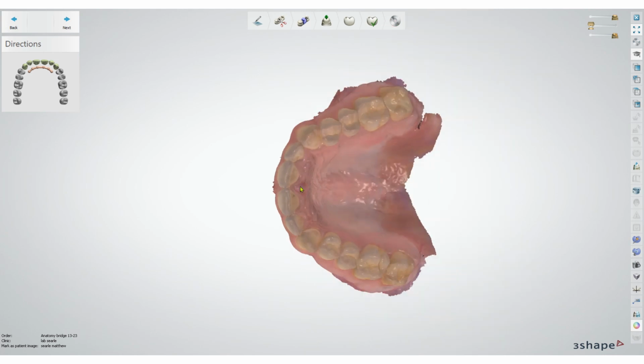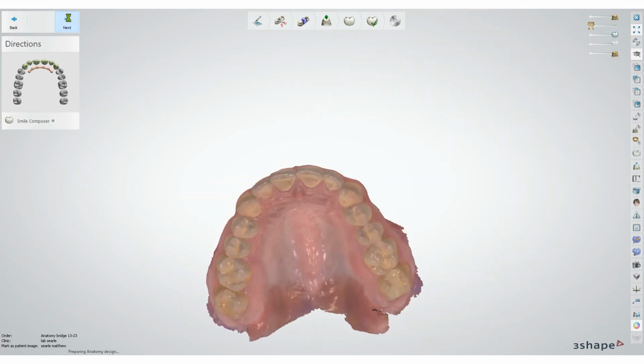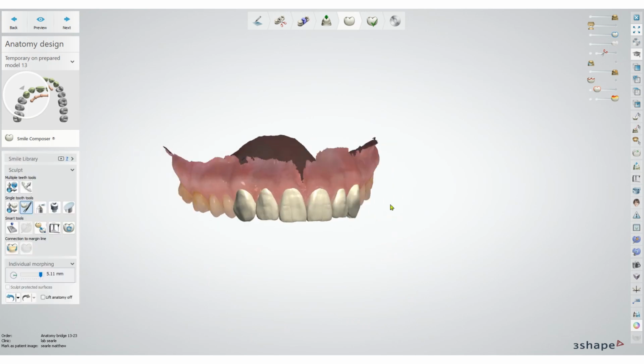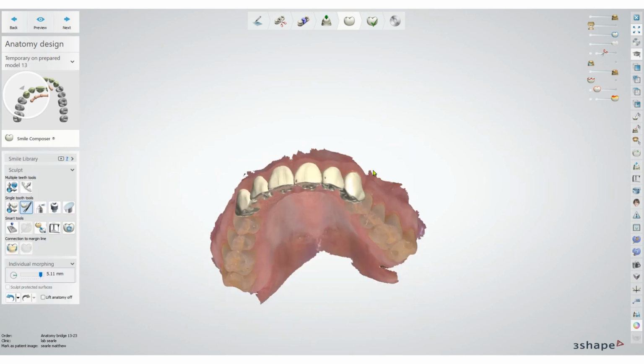Oh, stream read error, good work. Alright, once our smile design, that's because I've been in this about 3 times because I keep on getting distracted.